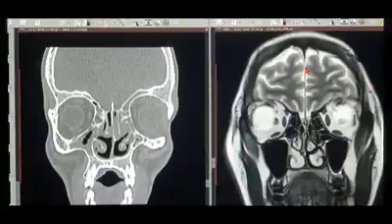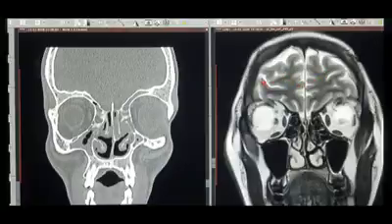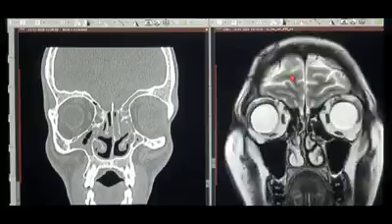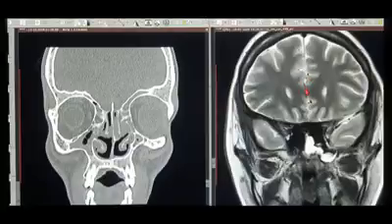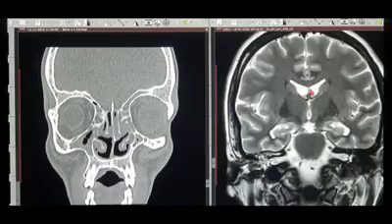On the MRI scan, as you can see over here, you can clearly differentiate the two lobes of the brain. That's the right cerebral, that's the left cerebral. You can also appreciate the alternate white and the gray. That is the gray matter and the white matter. You can see the sulcus, you can see the gyri. If you keep on going behind, you can appreciate the surface very well. And as you keep on going behind, you can see the fissure, you can see the corpus callosum on the coronal view. As you keep on going behind, you can see the ventricles as well.